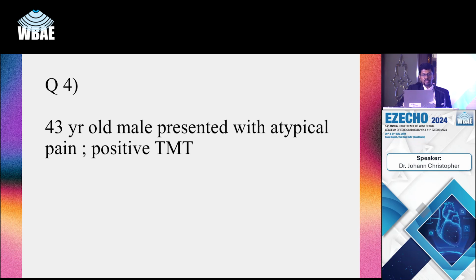You focus on the red arrow, and that is the plaque which is there. So the question will be on that, the red arrow. Focus on the red arrow. Patient with chest pain with a positive treadmill.